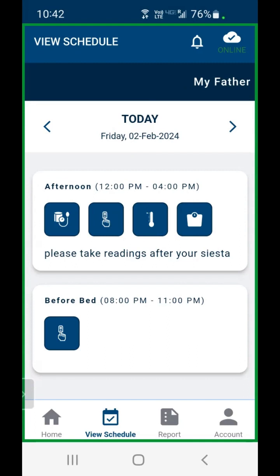This is what I wanted to show you as part of the personas, and how easy it is for us to take the biometric readings. You can see your last reading, you can see the history, you can see the trends, you can get notifications. And of course, one thing I did not show you is that if the phone is not working or not connected to the network, then there's an offline mode, so you can still take the reading, and the readings will be sent to the cloud as soon as the data connection becomes available. So with that, that was the demo of the solution.